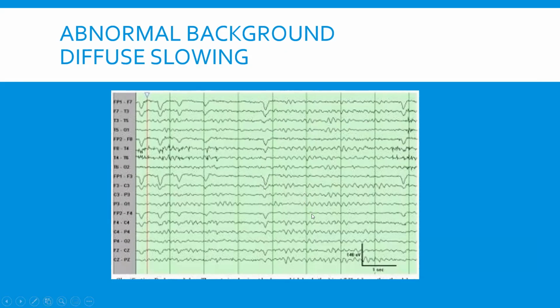And again, each one is 1 second, so we can even count these. So 1, 2, 3, 4, 5, 6, 7, right? Remember, each division is 1 second, and I only counted 7. So 7 is very slow. Again, in normal people, it should be 9. So 7 is abnormal. This person could be older, or could be taking some medications that are causing brain dysfunction. So that's probably why it's slow. Okay.